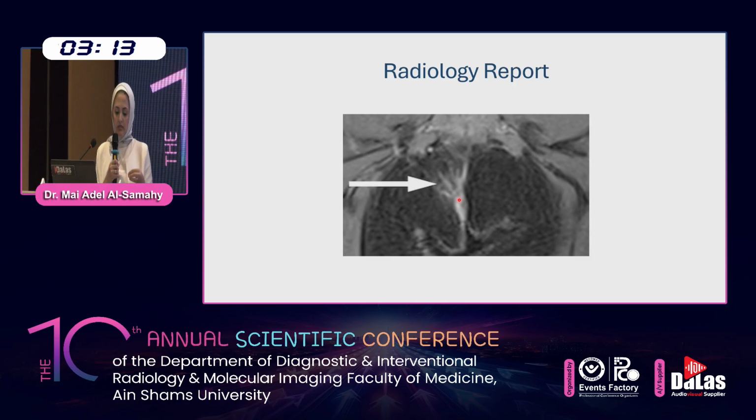In these cases, we usually describe these fistulae as complex fistulae, not complicated. Complicated fistulae are fistulae with abscesses, but a complex fistula is one where you cannot know the main branch and the secondary branches. So we just describe this as a complex fistula, and we try to describe almost all the branches regarding their course to help the surgeon adequately drain those fistulae.